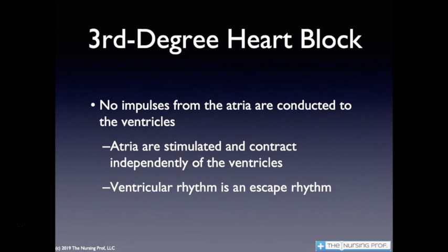Now, a third-degree block. All of the impulses from the atria, they're just chipping away up there. They're doing their thing, but none of them are conducted to the ventricle. So the atria is doing its thing, the ventricle is doing its thing, and there is no communication.